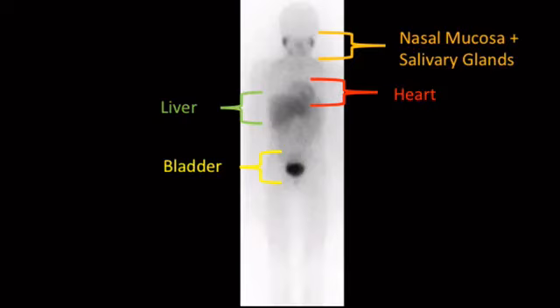So how do you know it's not a pheo? Like, oh no, there's uptake in the adrenals. What do I do with that? Well, most pheos would have uptake greater than the liver, like 80% of the time. So you can use the liver as an internal control. In addition to that, there's going to be a mass there. They must always have a lesion, so you correlate with CT or MRI.